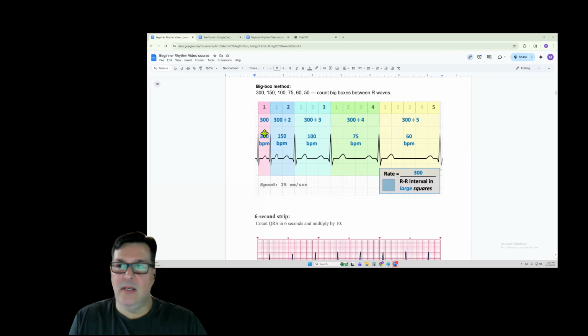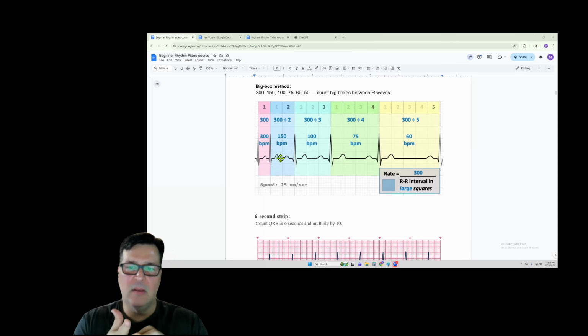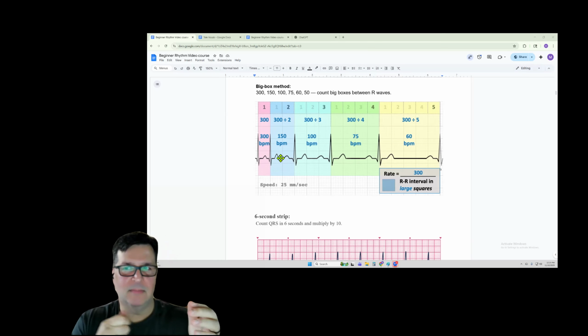So you can do the 300 for one box, and you understand what I'm doing when I look at one box, one R to R on either side of one big box, right? All these questions are directed to you, Elena.